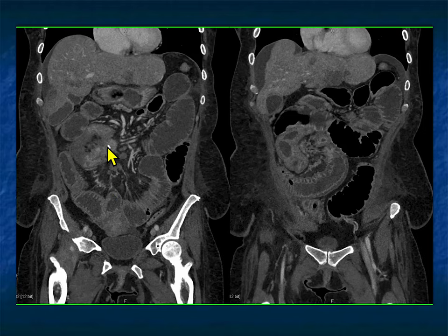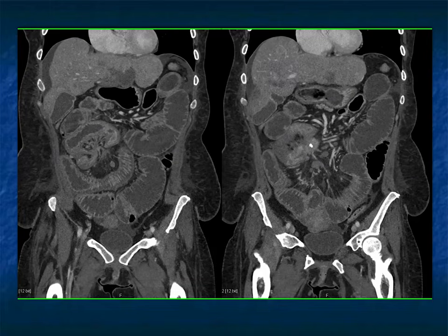Now, in terms of desmoid tumors, in terms of carcinoid tumors, in terms of lymphoma, in terms of sclerosing mesenteritis, any of those entities can have calcification, but about 70% of carcinoids have calcification. But you also see the desmoplastic reaction, and then, of course, often we'll find the mass in the small bowel.